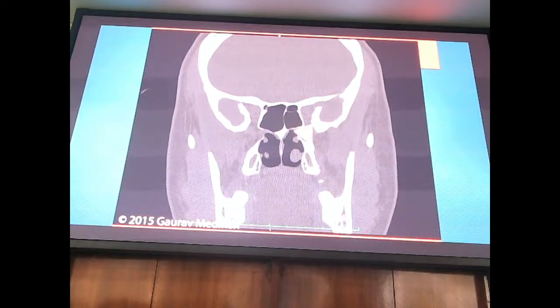So this is the pterygopalatine fossa that you can see here, below the level, behind the maxillary sinus. Observe now, the maxillary sinus is almost reduced to nothing. This is the interpterygoid or scaphoid fossa, what we call. This is the space between the two pterygoids. And what do we see here?